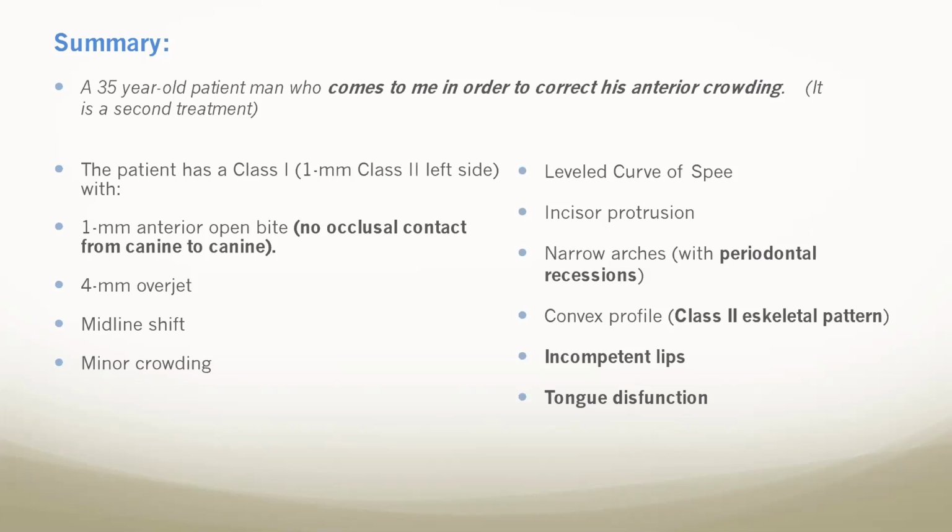And another very important thing is that it's a second treatment, okay? He underwent an orthodontic treatment some years ago. I guess when he was a teenager or whatever.